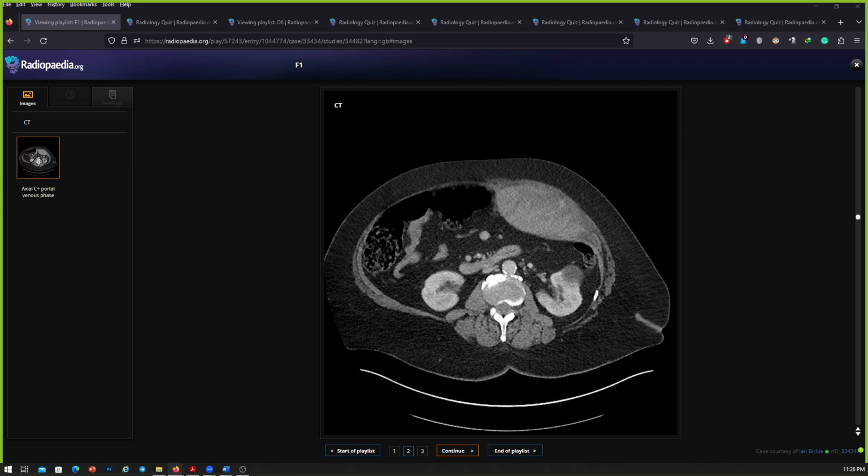So candidate 1, well done. I will just start sharing the rest of the cases, but before that, yes, this is an emergency, Dr. Amna. Even if it doesn't have active bleed, you have to treat it or manage it as an emergency, because the patient might be clinically unstable, hemodynamically unstable, so that depends. As a radiologist, we sometimes might not know the entire picture. So even if it is not an active bleed, not an active extravasation, for exam purposes, treat it as an emergency.